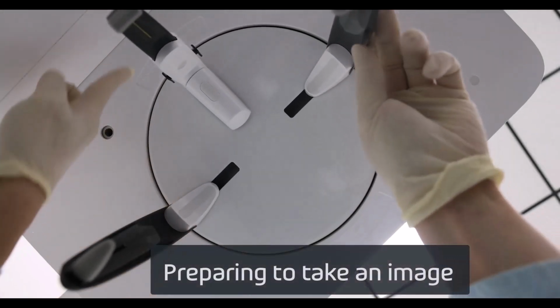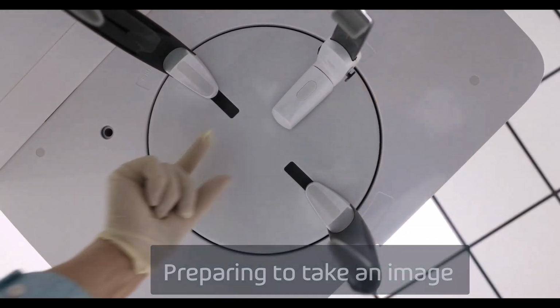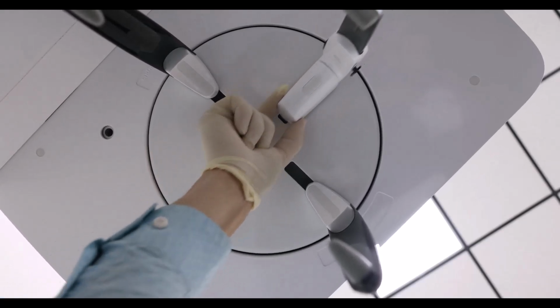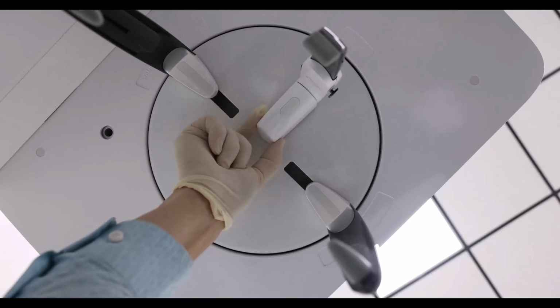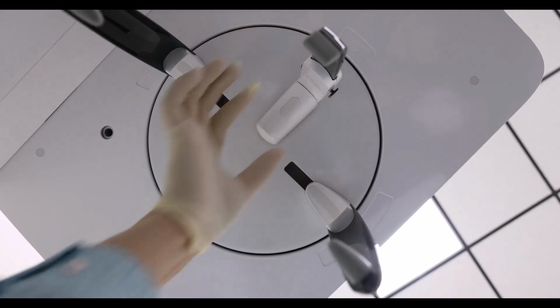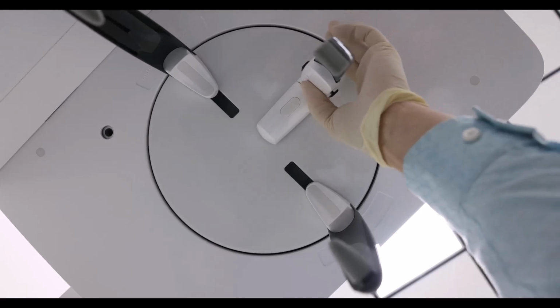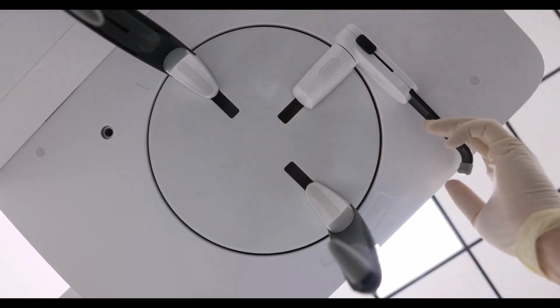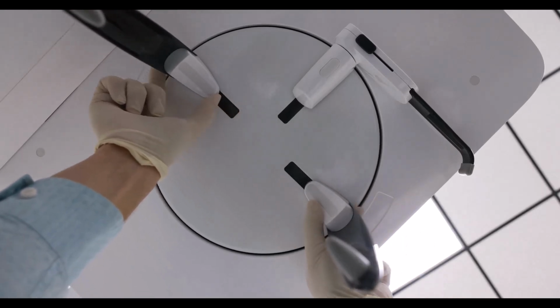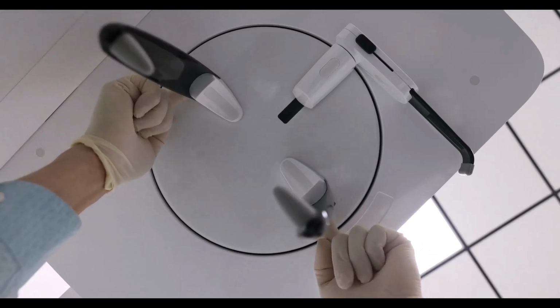Our Ceph positioner moves to the PA or lateral Ceph positions. To move this, the easiest way is to move it at the very top, touching the top horizontal platform. The Nasion bar folds up, folds down. Also, if we press the side buttons here, we can move this up or down. Our ear rods are easily moved at the top of the bar. We want to push these in.